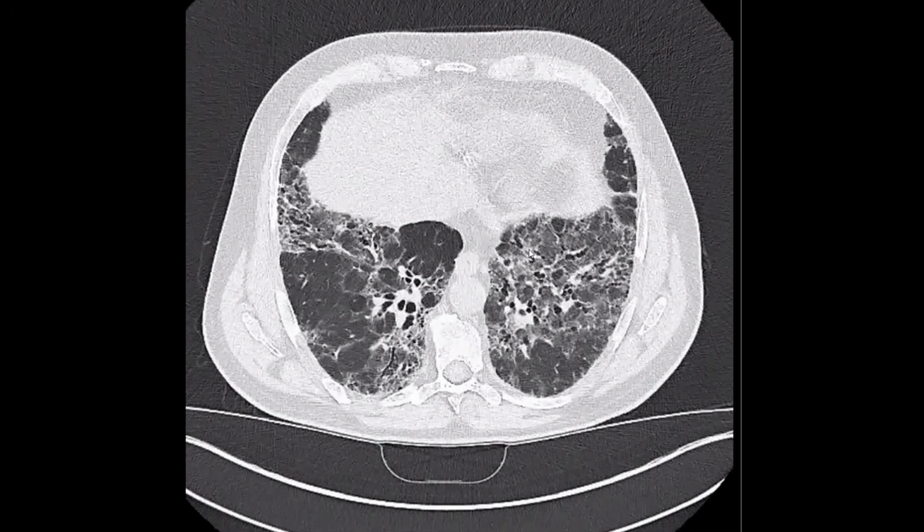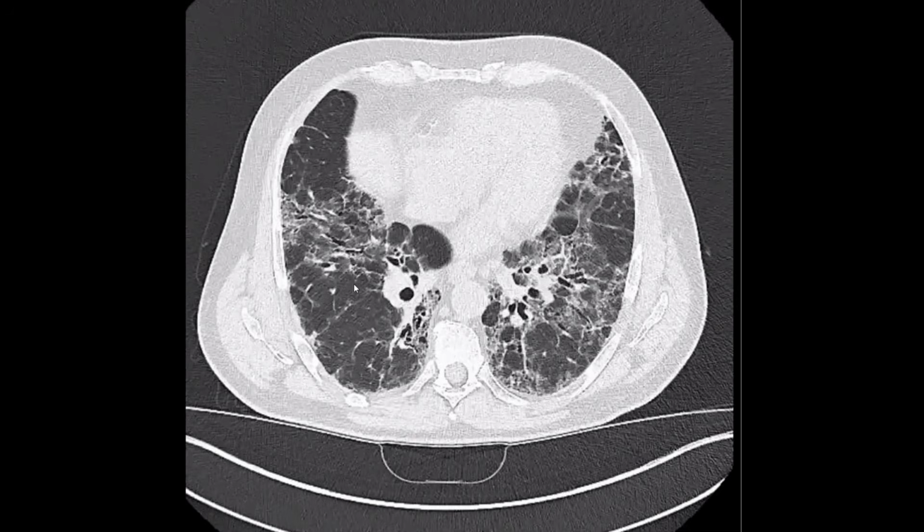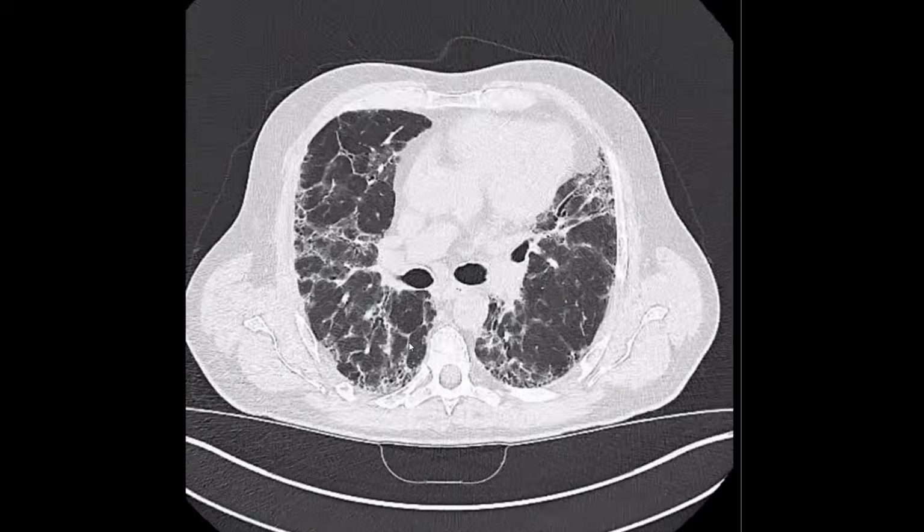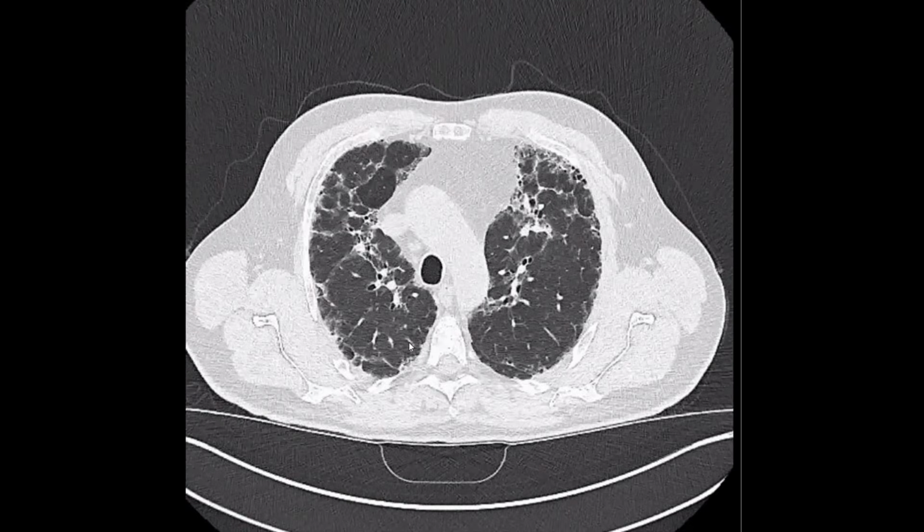So once we have central lung fibrosis with mosaic attenuation, you should think of another etiology. You should suspect hypersensitivity pneumonitis, so you should ask to do an expiratory phase. By the way, if you have an undiagnosed case of interstitial lung disease and this was the first scan for you, please do your best.